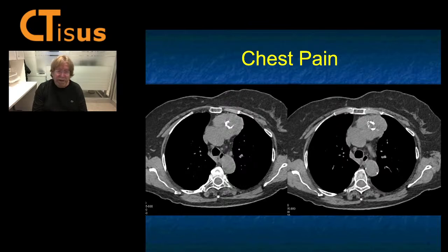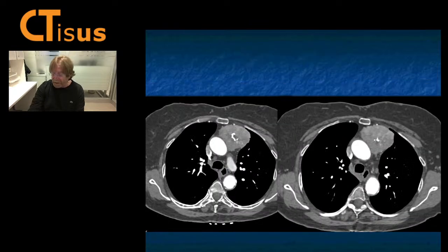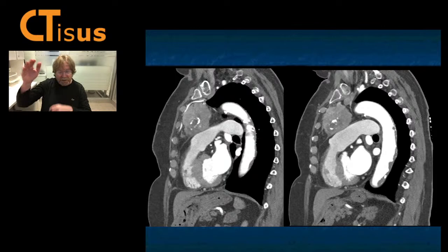And then everything within the thymus. Unlike the last case, is not a thymic cyst. Could it be a thymoma or one of those unusual thymic tumors? Here is a lesion with contrast. There's some enhancement, though not a lot of enhancement. And here it is in the sagittal view, so you see the upper and lower limits. It's not thyroid coming down. It's an anterior mediastinal mass, eccentric.